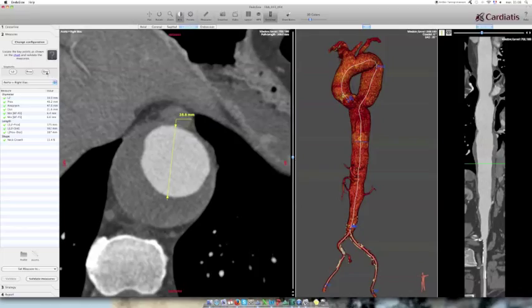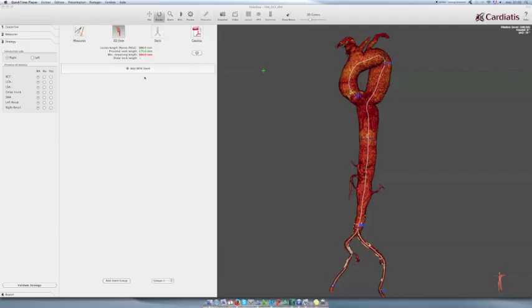On the left side, we have the most important points: the landing zones, the proximal landing zone and the distal landing zone. These points are where the MFM will virtually start to be implanted, in the proximal landing zone. When we go to the strategy phase, we're going to do the virtual implantation itself.